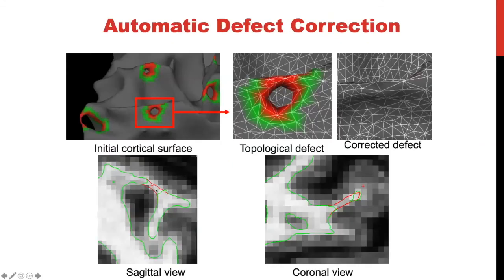This is also an analysis tool that you can use. In FreeSurfer, as Dev mentioned, we have the option of representing our data using a heat map. If you look at it through the 3D volume, you see where the hole is being described, and when you reference back to your 2D volume, that is not a hole, that is just a misclassification of white matter.